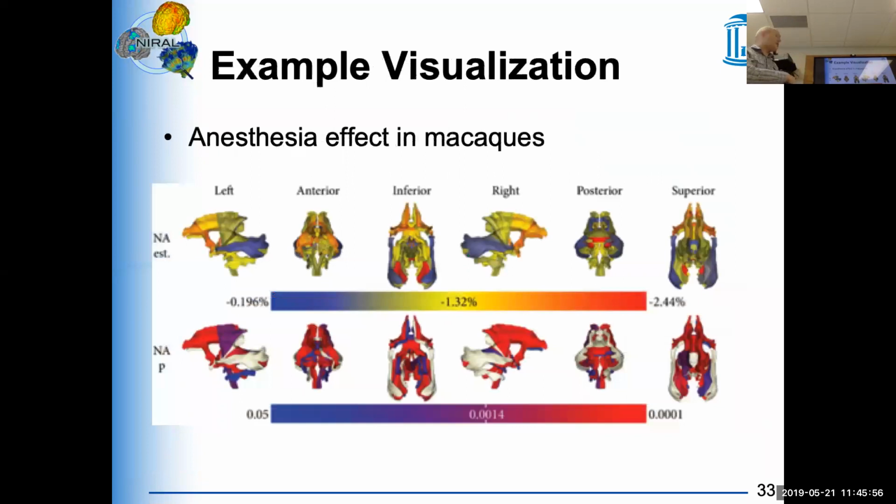This is an example visualization for if you run statistics now and you propagate those back to the tract. And in this case here, it didn't even do the whole profile, but we took the profile, made it an average FA for the whole profile, and then we propagated back that whole profile, which is why you see each tract kind of getting one single color. But even for this, you can use Merge Stat with Fiber.